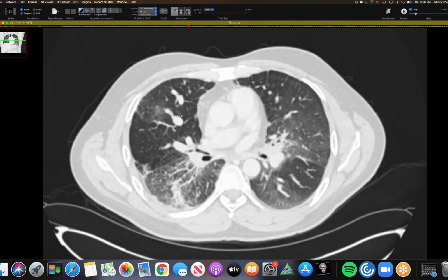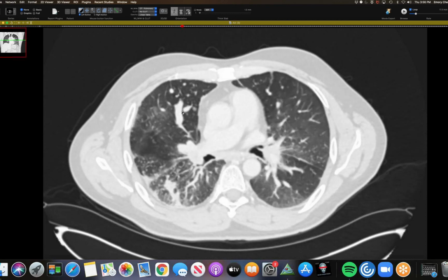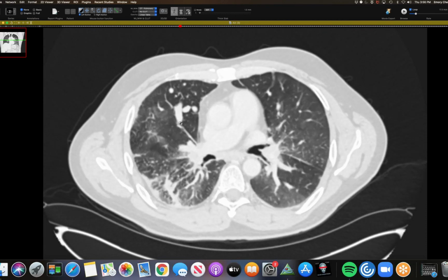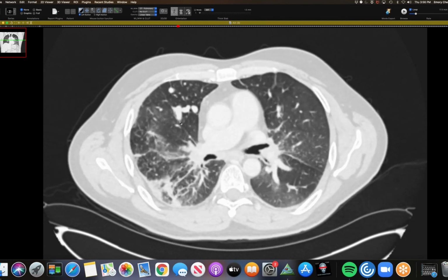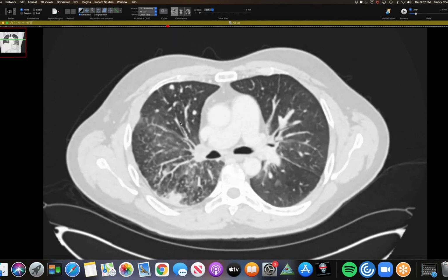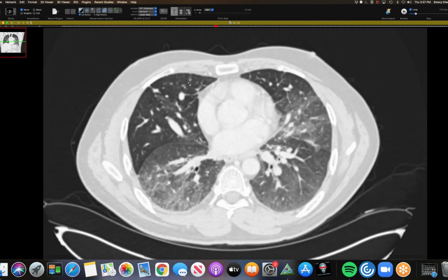If one of the branch veins is occluded, blood just shunts to a different route if possible. Probably these channels open up because fibrosing mediastinitis is such a slow process that the lungs have years to find alternative pathways. We also see transpleural collateral vessels that open up as well. That pleural thing looks almost like, not quite septal thickening, but there's a little. You even see a little bit there. He probably has some of it.